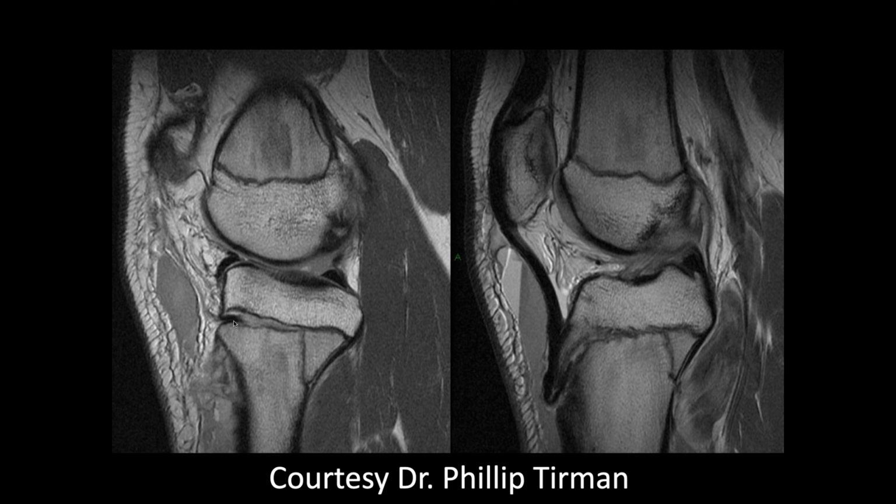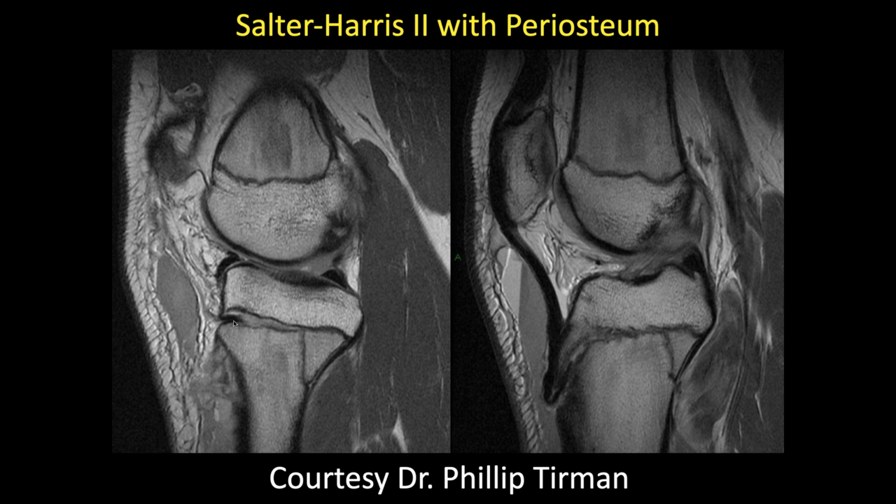So in the past, when we've talked about these, John has been of the opinion, and here we can see that periosteum flipped in here as well. Obviously, there's been a lot of displacement here, a lot of hemorrhage into the soft tissues. What to do about this? We've said in the past that you don't want to go back in and re-irritate the growth plate here, as that increases the risk of fusion, and that these can be left in place.